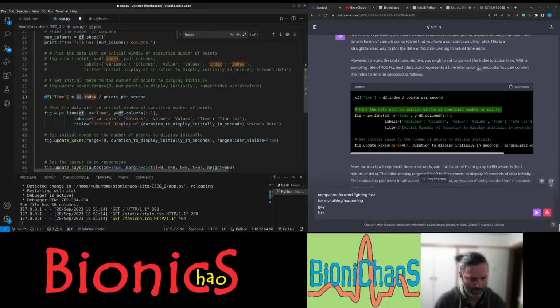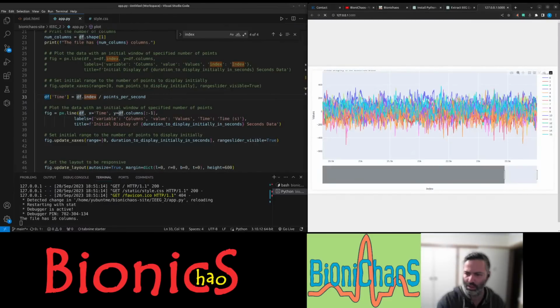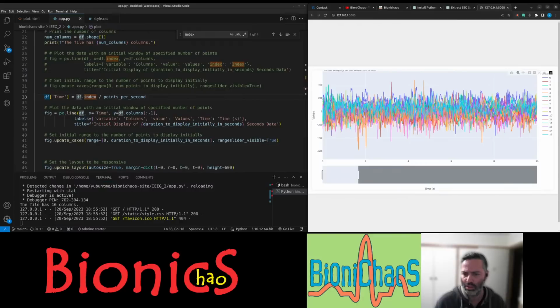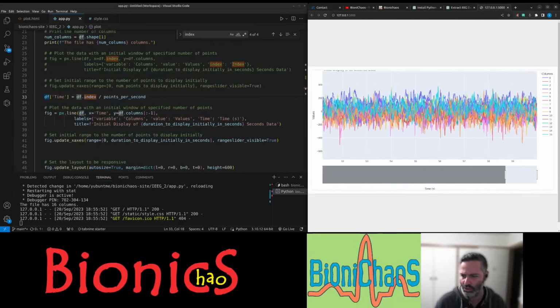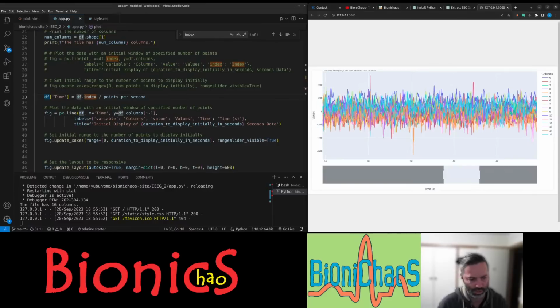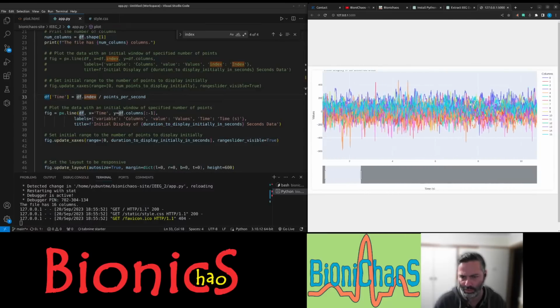Right, so that's showing 10. This should be showing 60, so that's correct. I don't know what it was hallucinating before.